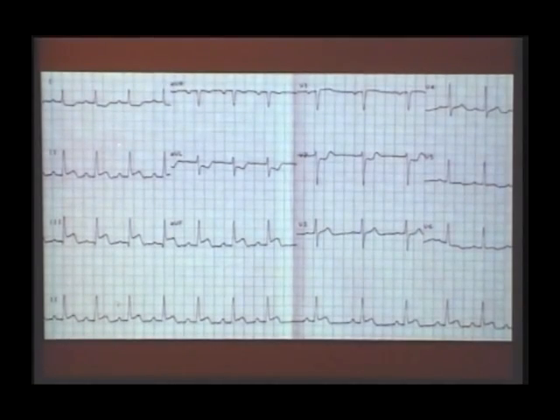So you can see it here, the inferior leads. The ST is elevated here nicely, but the T wave is upright, concavity is maintained. So this is an early hyperacute phase. What is the single sentence diagnosis for this ECG? Acute occlusion of RCA. So once you record the inferior wall elevation, what must you see? V1, V2, there is ST depression. So what's happening? Posterior infarction.